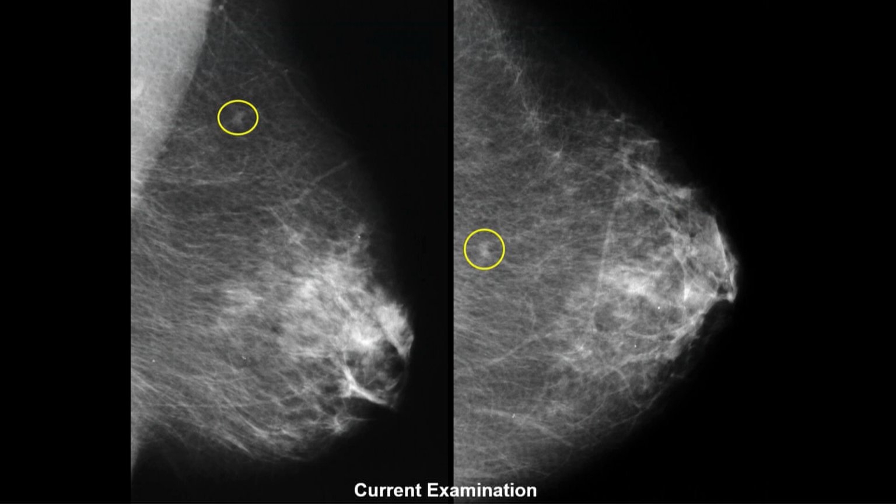All right. This is a sort of typical developing asymmetry. And if you're screening every year, these are going to be small, because they weren't called the last time. So most of these are going to be less than a centimeter. Many of them are even a little bit less than 5 millimeters. They're small. These are the earliest cancers we find. All right, there's one there. You can see it.